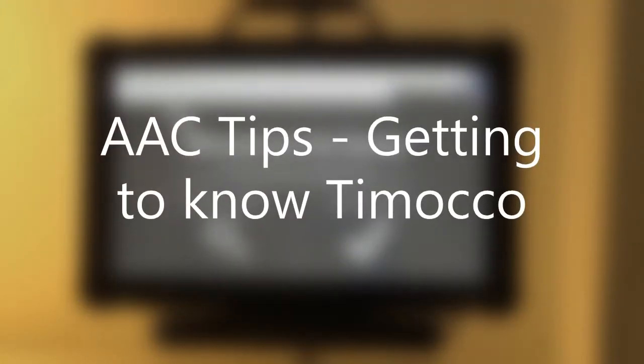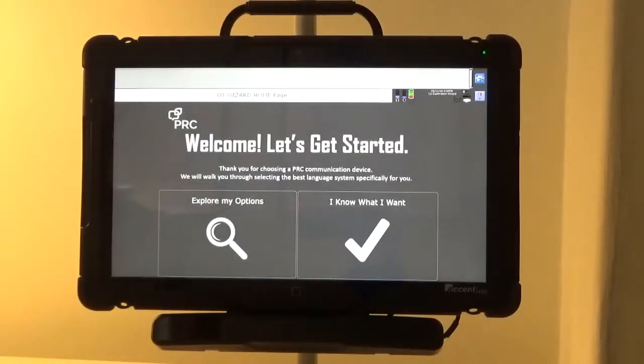Today we're going to have a look at the Timocco software, which is designed to target motor, cognitive and visual attention skills for children and young adults. The Timocco software is available for free and in full on all new Liberator Accent 800, Accent 1000 and Accent 1400 devices. This includes the full set of 25 games included with the price of the Accent. This replaces Look to Learn, which used to be available as a demo version on our devices.